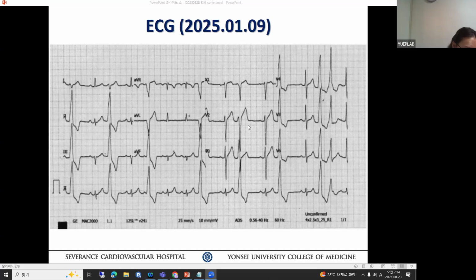What else can you tell us in this ECG? So we talked about this before. An electrophysiologist reads the ECG differently than a cardiologist. We want to look at the mechanism of the interactions as well. So if you look at the third QRS complex, the PVC, in the bottom lead 2 strip, what do you see just before the QRS complex? What is that?